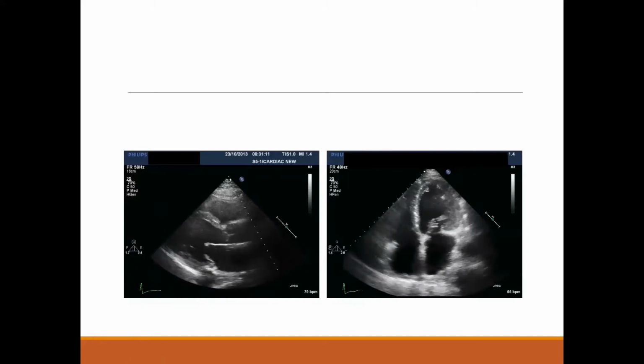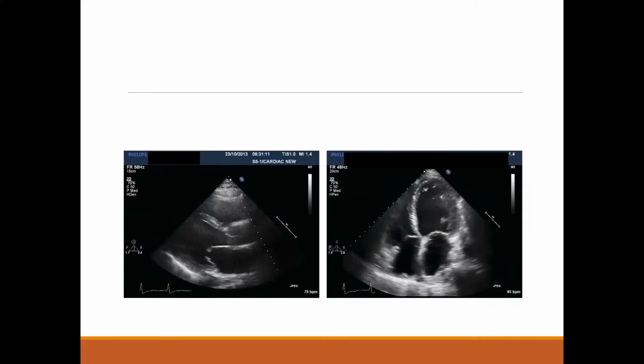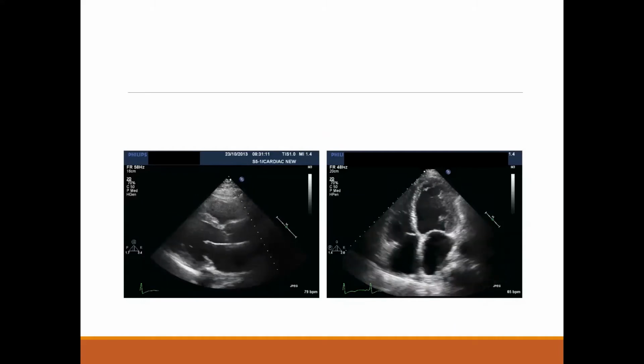But don't ever say non-ischemic cardiomyopathy in the exam even if you find it global. Why? Because it might be ischemic. Yes, we agree that ischemic cardiomyopathy usually manifests as regional, but sometimes it can be global. So you cannot conclude that this is ischemic versus non-ischemic based on being global or regional. Most likely, if it's global it's non-ischemic, if it's regional it's ischemic. Yeah, we agree, but don't write it in the exam. Okay? But this is global hypokinesis, severe LV systolic dysfunction, and dilated LV.